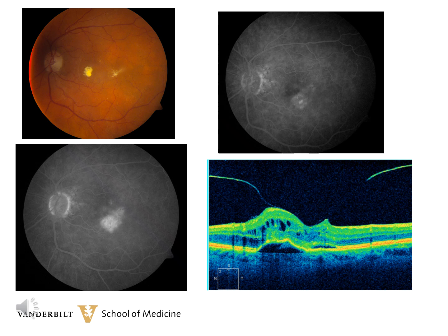In February 2012. Oftentimes, unlike other types of age-related macular degeneration, there are hard exudates and there may be some superficial hemorrhaging. On the fluorescein angiogram, there's diffuse hyperfluorescence, as one may see in an occult net, but there's also a hot spot, which is the site of the proliferans.